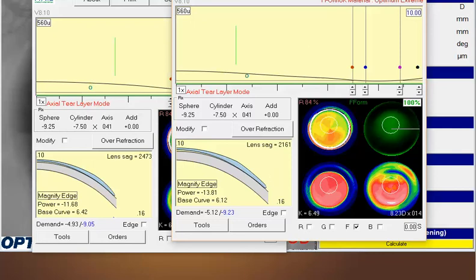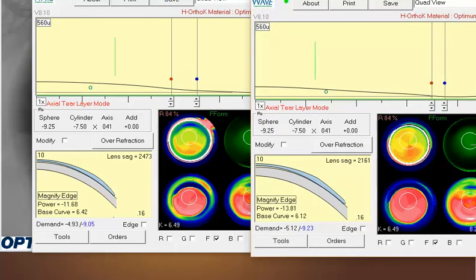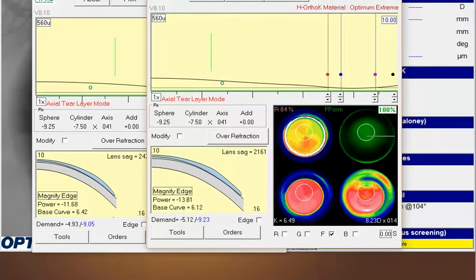Well, hopefully that tip will give you a little bit more helpful guidance on using your trial lens data to incorporate in there. You can use that same philosophy with their prior lenses. The patient had their prior gas perm lenses. You can put that data in here and adjust the lens so you can kind of mimic or simulate a lens that they were wearing.